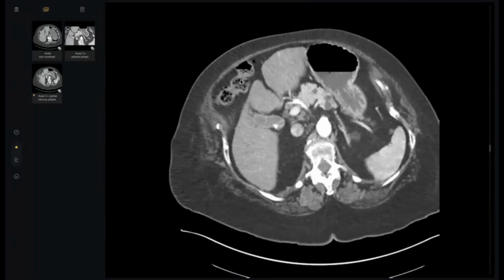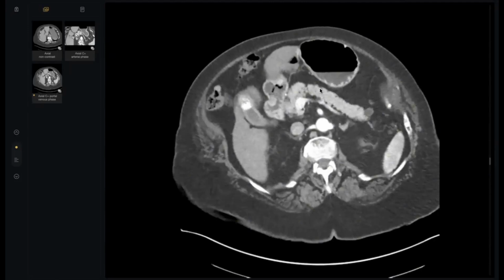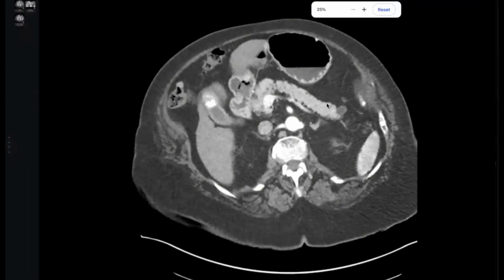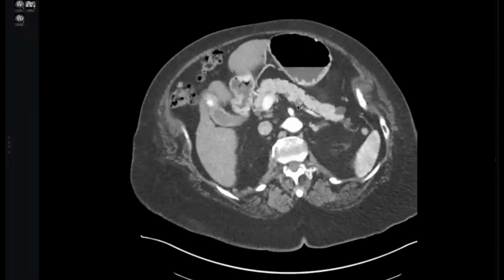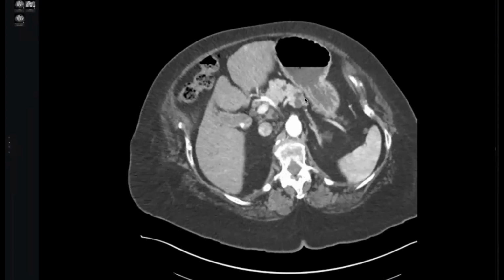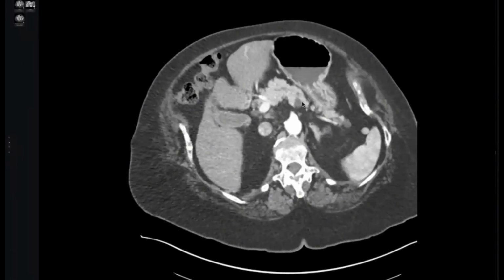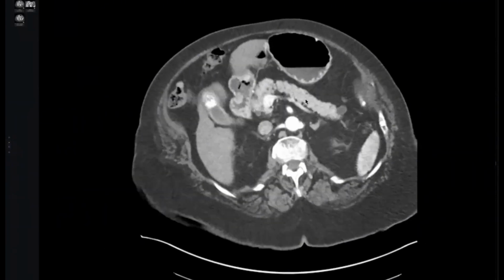Okay, but look here, please concentrate, all of you, in the neck. I will zoom in. Concentrate here. See, this is the cyst. Then see, this is the duct, and this is the communication here. So the cyst is communicating, at least this cyst.